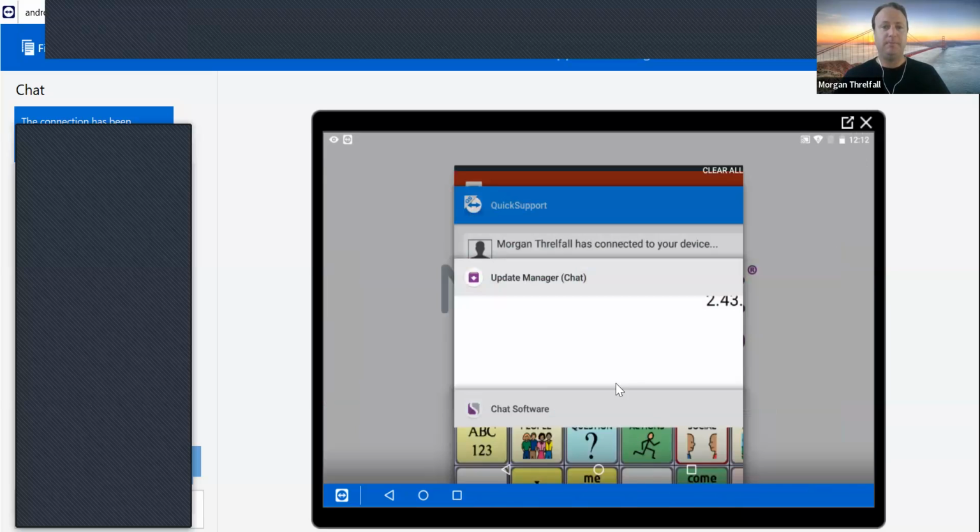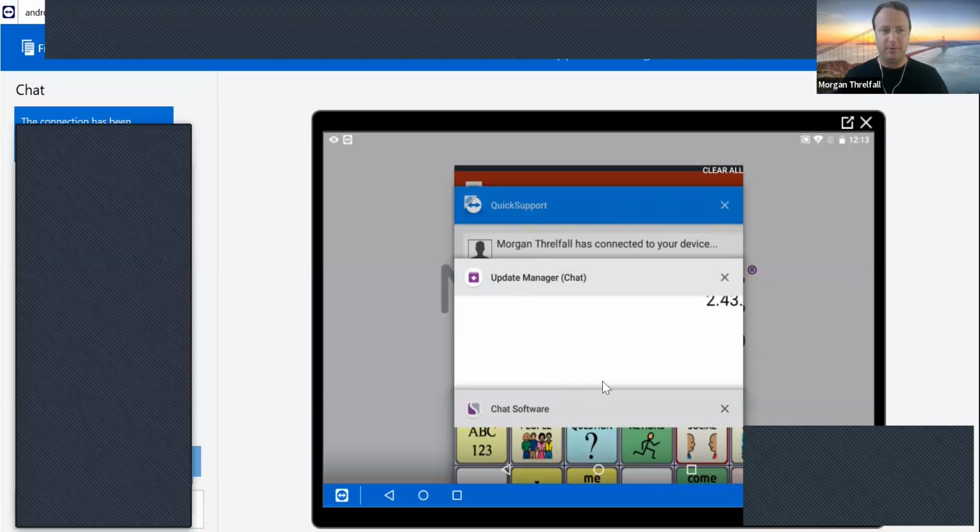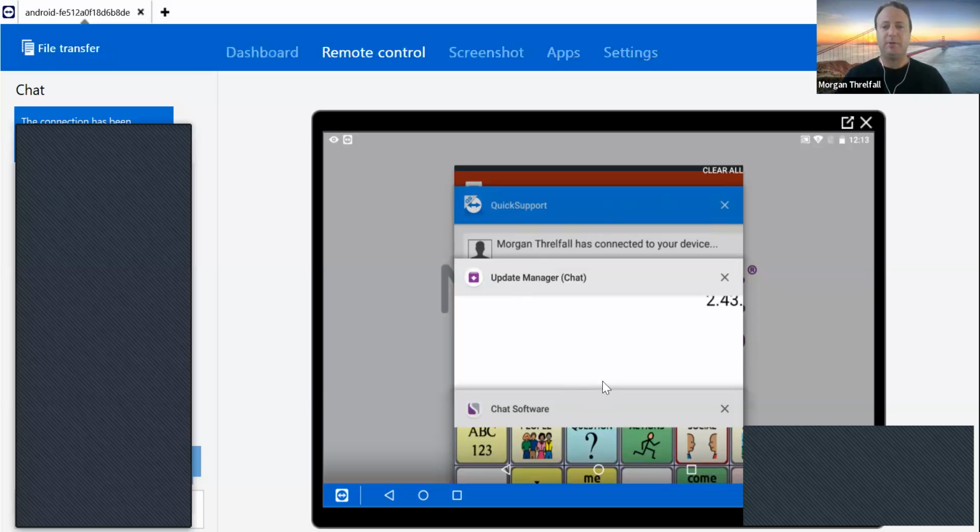So if I click on the square, it will show me all the different programs that I've been recently using. And I might want to close some of those to allow me to have more power for the communication software. And it's just like on our phone, where if you have a lot of apps open in the background, we often open it up and close down everything in the background to allow the device to run at its most powerful.